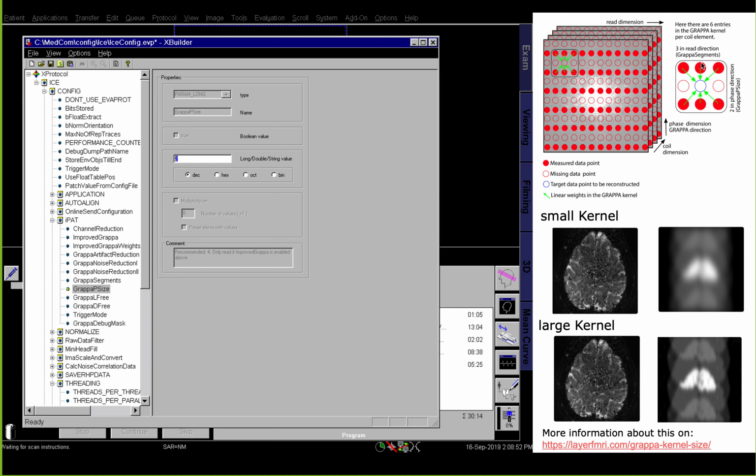We can, of course, also use a larger patch of k-space. For example, here like 4 by 3 or something, so that we also take these k-space points into consideration when reconstructing that one, which can help sometimes. Especially when you have specific areas in the brain that you care about. And I'm saying that with respect to k-space earlier because you might have learned that a small part in k-space refers to smooth images and vice versa.